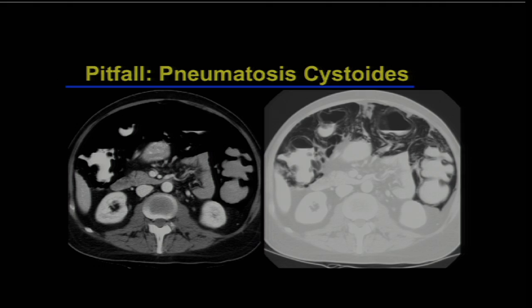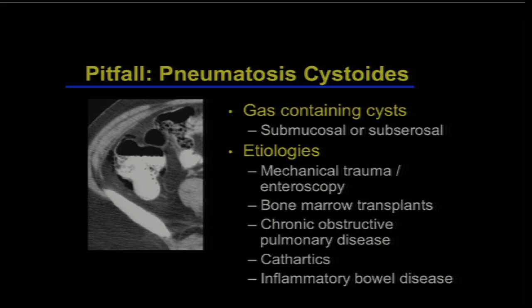Another reason I don't like it is because we see many cases, if we look carefully, where there's pneumatosis and no symptoms at all of bowel disease. These are patients in our hospital. Many transplant patients are on immunosuppressants. For some reason, they get pneumatosis cystoides intestinalis. This tends to be subserosal gas, and it may last for months. It may get worse slowly over time, but the patients really don't have any symptoms. They don't have an elevated lactic acid.